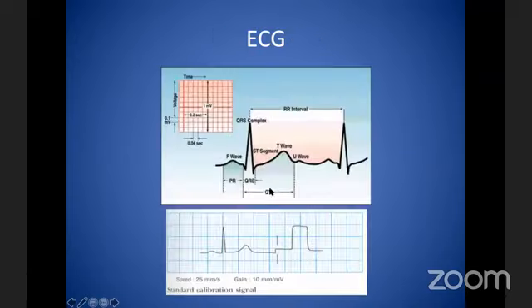Okay. In the normal parts of the ECG, you have a P wave followed by a QRS complex, then the ST segment leading into a T wave. Two other things to remember: always look at the speed, and look at the voltage. The speed should be set at 25 millimeters per second. Speed is on the horizontal axis and the gain is on the vertical axis.